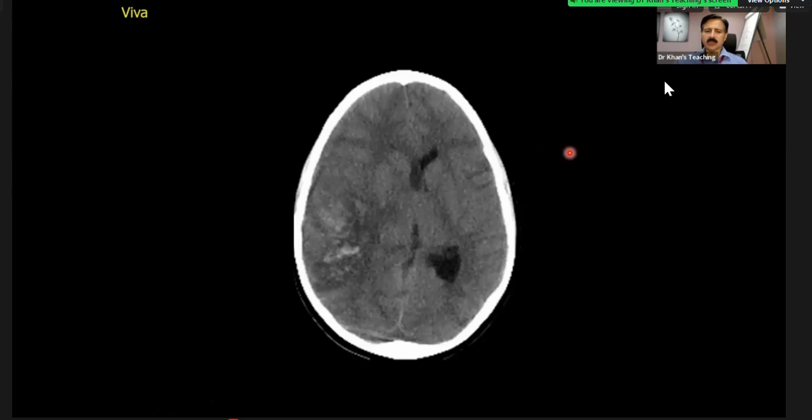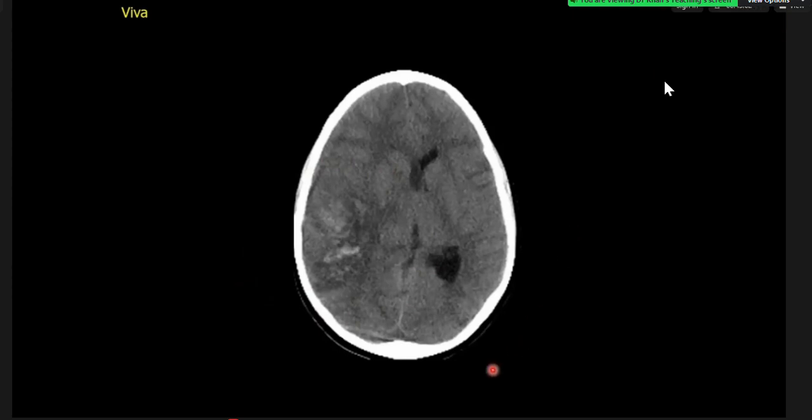Okay, my question is a lead question. How will you tackle this? How will you describe it? Can I hear your description, please? Yeah, there is trauma.